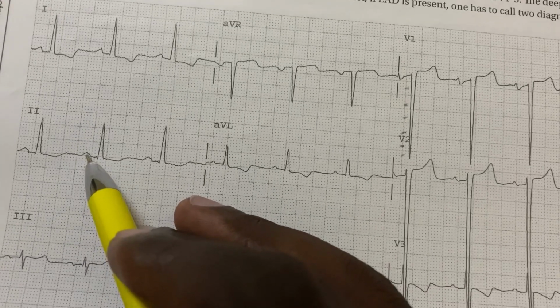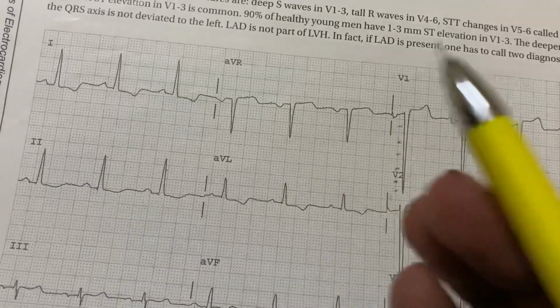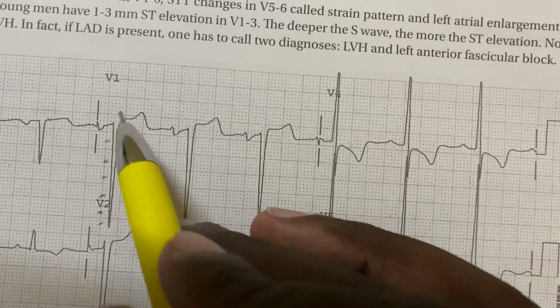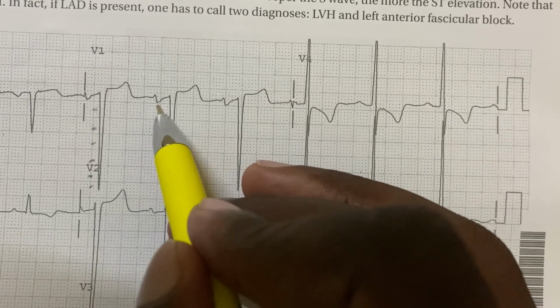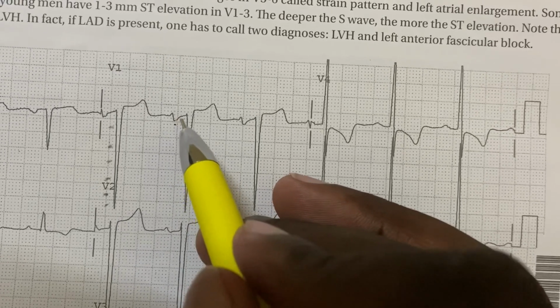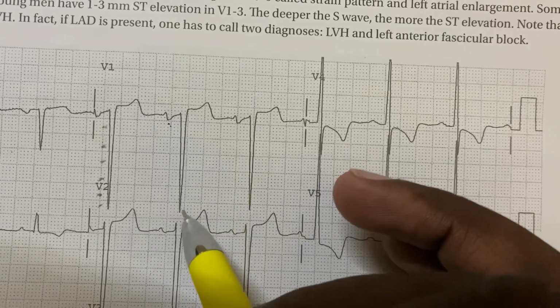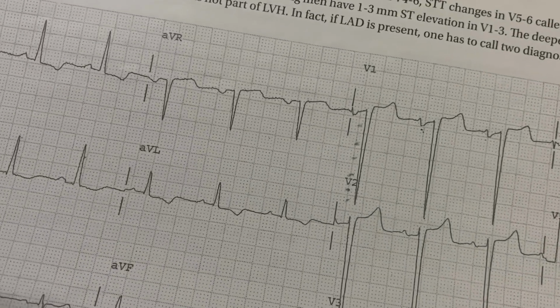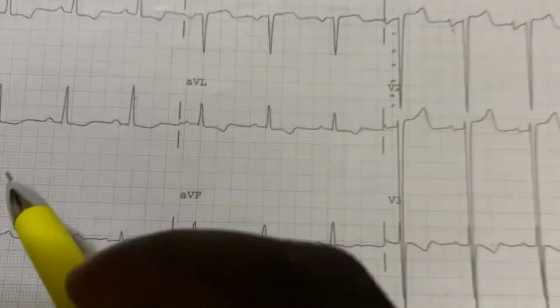This is the P wave, identifying them: P, Q, R, P, Q, R. In V1, as we said, this is the P wave and it has to be biphasic: P, very small r, and then S. So, do we have atrial enlargement? Remember the criteria and the normals we said.